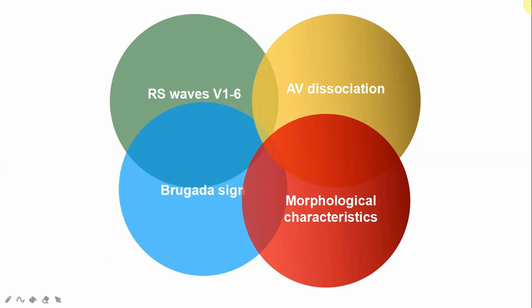Okay folks, it's time to wrap up now. The Brugada criteria has a very high sensitivity and specificity in the diagnosis of ventricular tachycardia. If the ECG shows a wide complex tachycardia, Brugada criteria can be applied for ruling out or ruling in VT. Let me summarize to you the Brugada criteria steps. There are 4 steps in the Brugada criteria.